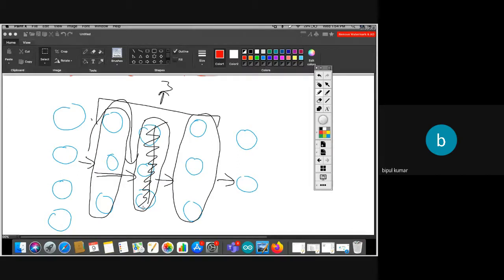For this model preparation, I will use the functional model only, so that we come to know that we have two options to create a model, sequential and functional, and how both of them can be used. Right, let's check it.